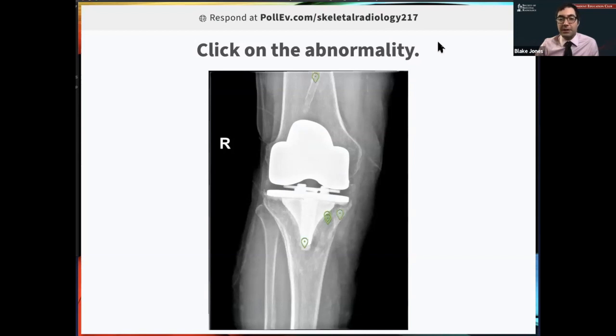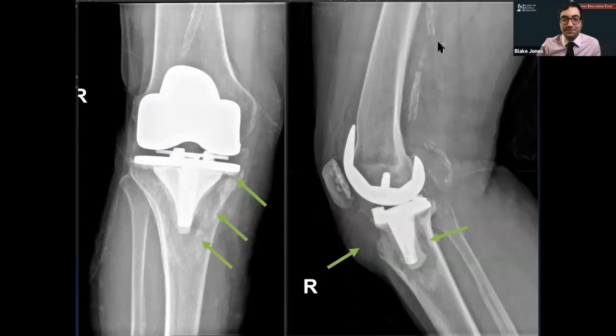Okay, excellent. Everybody's arrows are okay. I like that somebody clicked on the vascular. Gosh, that's nice. But obviously the arrows are dropping all over this sort of lucent area there. So that is excellent. But yes, the vascular calcifications are indeed abnormal. That is true. I cannot disagree with you.